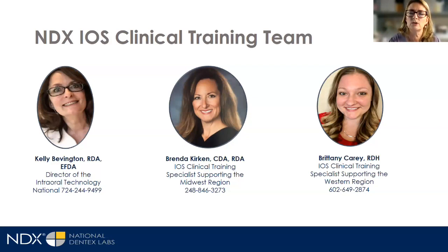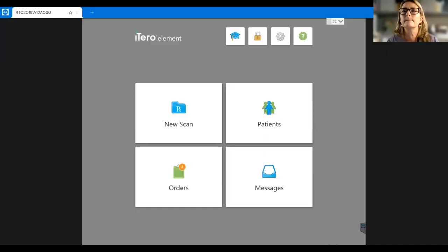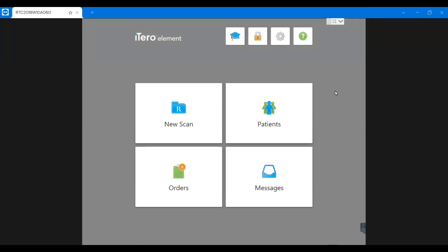Okay, so I'm going to stop sharing the PowerPoint presentation, and I am going to start sharing the iTero screen. I think everybody should be able to see my iTero scanner screen. Can you confirm that, Jessica? Yes, we can. Great, great, great. All right, so I'm going to scooch out of the way a little bit.